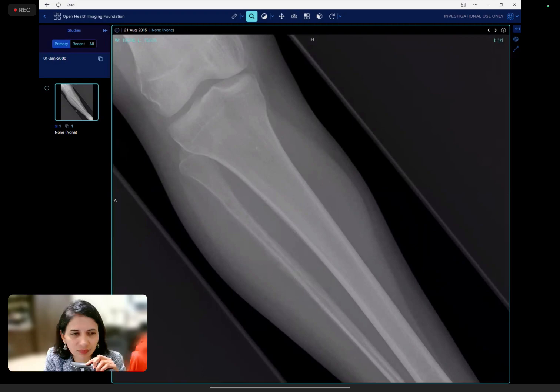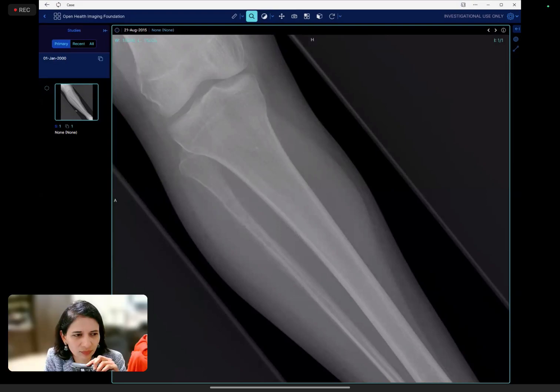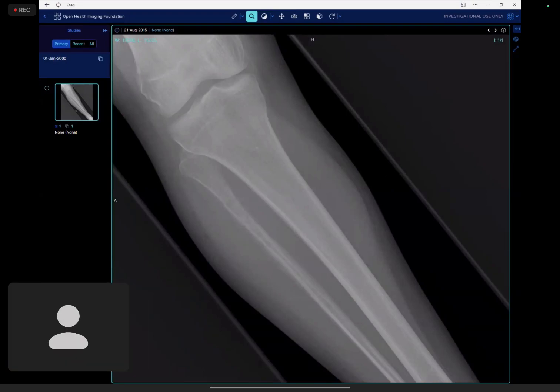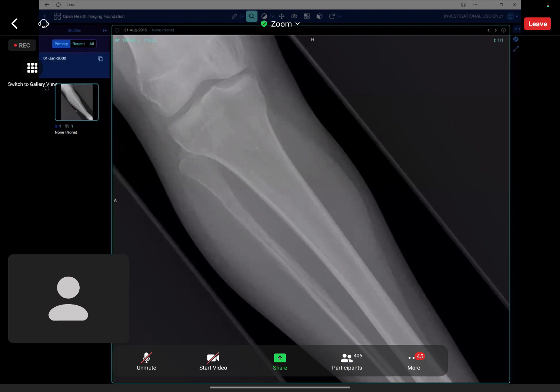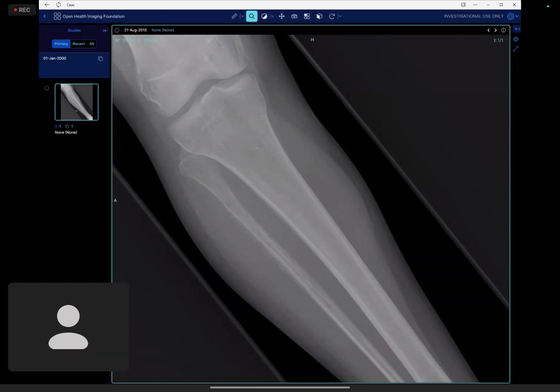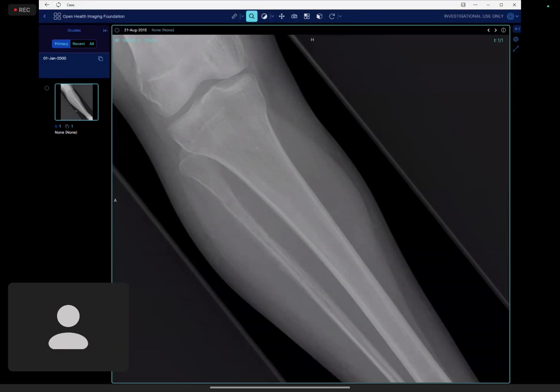So I can see that there are regions of periosteal reaction extending from the proximal aspect of the fibula to the mid and possibly distal fibula. This is rather irregular, and again there is micro scalloping of the cortex, but I cannot really see any lucency or expansile lesions within. The tibia appears unremarkable, and the surrounding soft tissue does not appear to be grossly swollen.